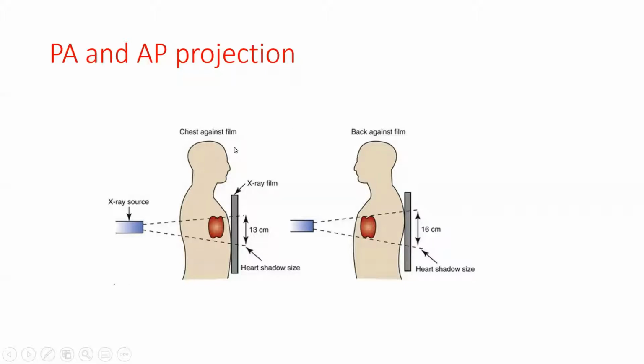So what's the difference between the two? The quality of the X-ray is more accurate here.